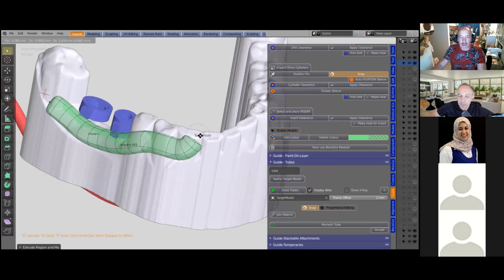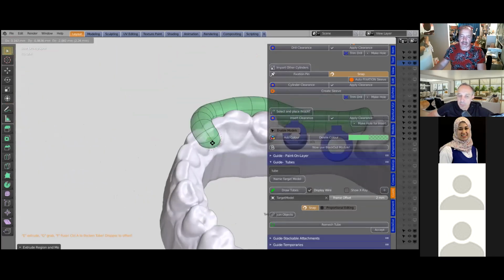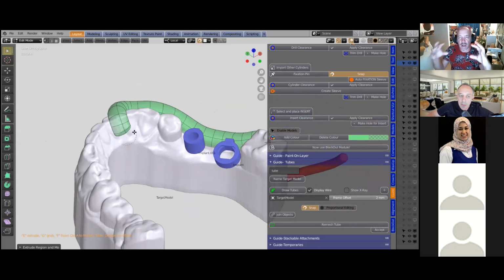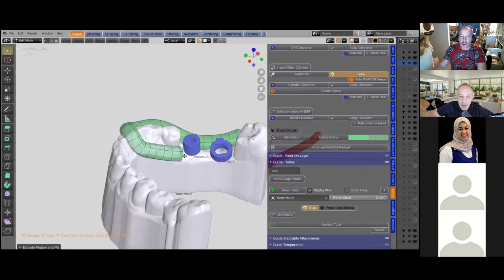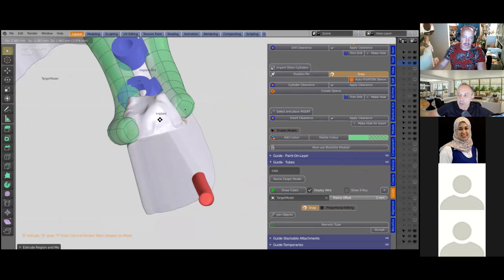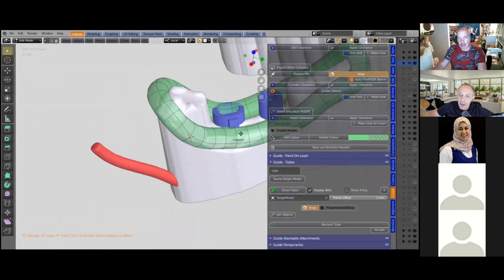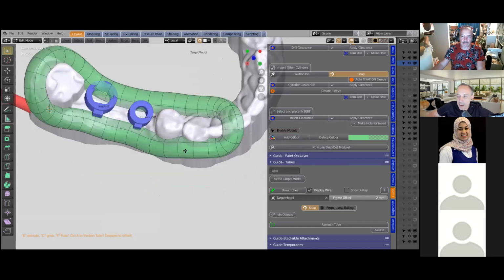Yeah, and also you don't have to go through the top. You can cut straight through the teeth as well. One of our users always cuts all the way through the teeth, so you've got like a bracing. Can you demo that on maybe one of those tubes? Yes. Or alternatively, you can even have a combination of a layer and a tube. I can actually demo that. I think that the tube does offer a very good irrigation though.